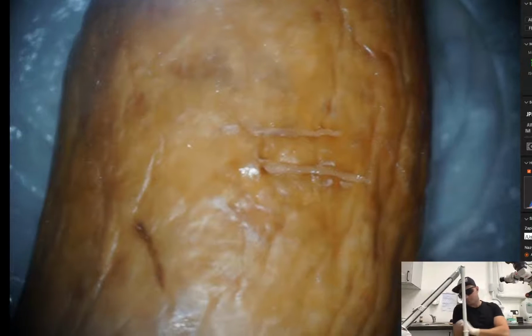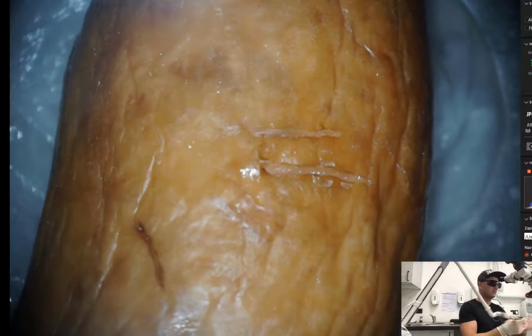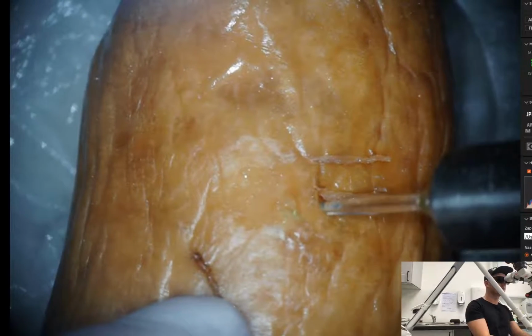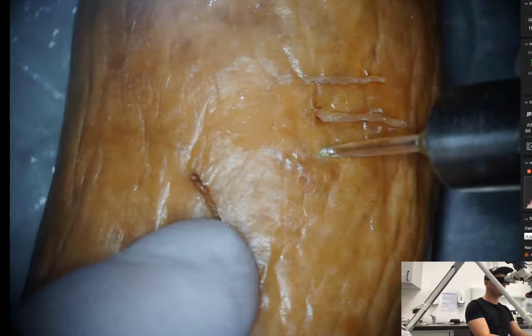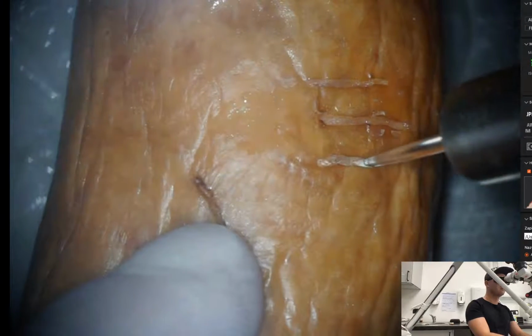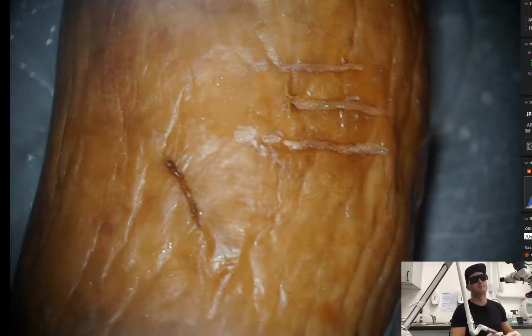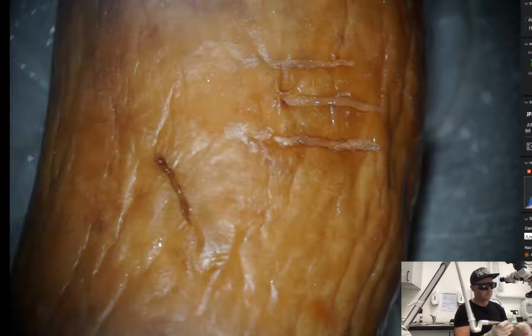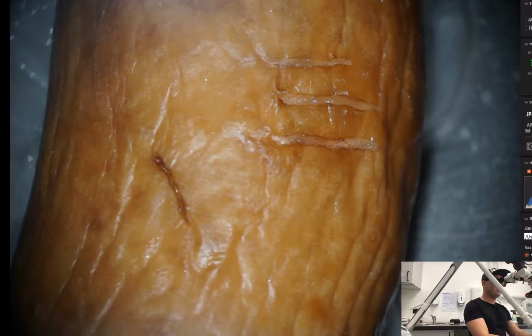Okay. I will set 30 Hz frequency, and let me just go with the cut. And again, the cut is deeper than before. 40 Hz.